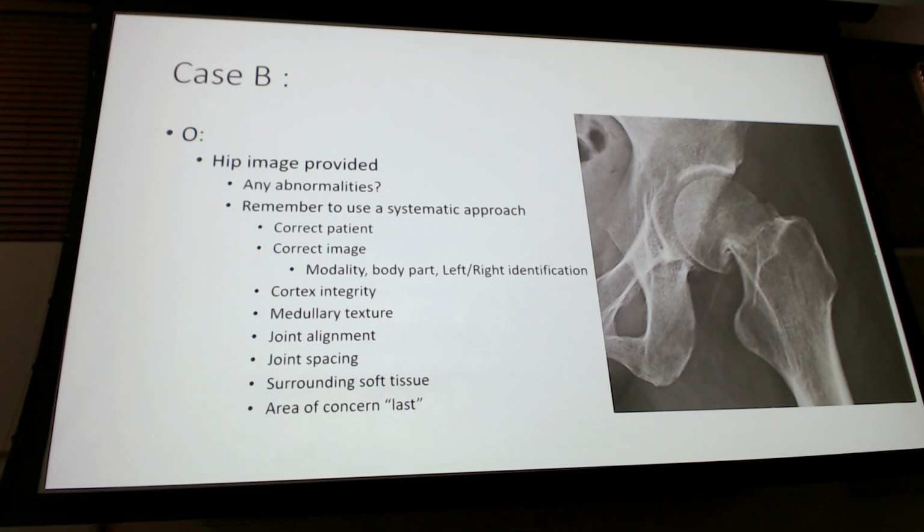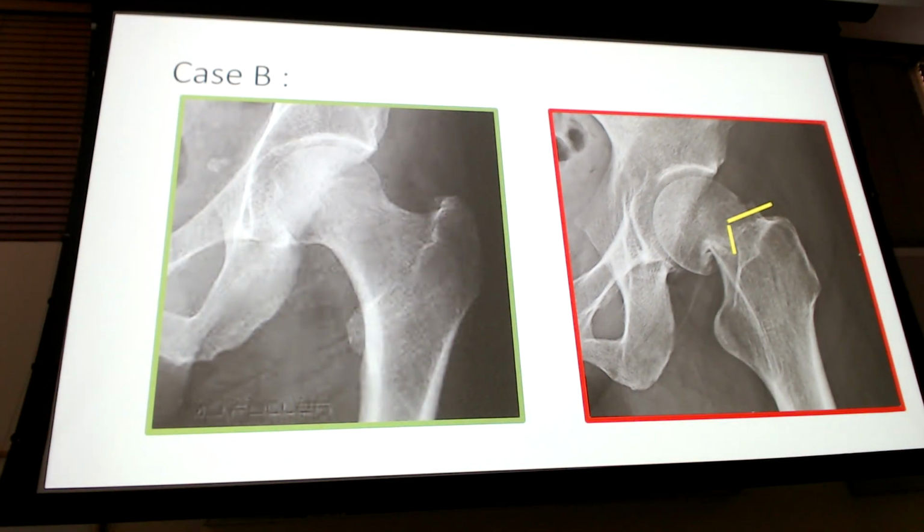Okay, here's your picture. I know. You know how hard it is to find good femoral neck fractures? What's that? If they're in the slideshows, they're not on the test. Sometimes there's one or two that slip through and I didn't realize because I have limited supply, but usually they're not. Alright, so since we've seen it before, we'll go a little bit quicker.